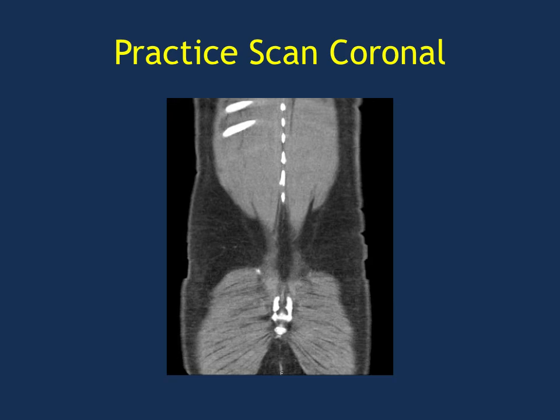Anyways, we'd like you to be able to follow the bowel as much as possible. Although, like I said, we don't expect you to follow the small bowel for, like, jejunum. I think esophagus to duodenum, and then if you can follow the entirety of the colon, and then if you can follow the major vessels in the abdomen, I think that would be perfect. Or you'd be doing really, really well.